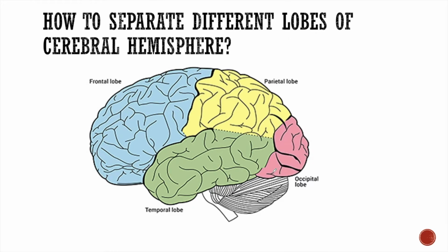As we see in this image, as we go more cranial above the level of the ventricles, the occipital lobe is no longer seen in the sections, and the only lobes that we have here are the frontal and the parietal lobes.